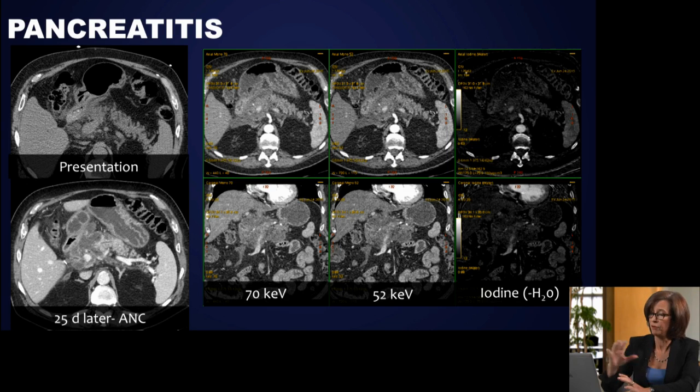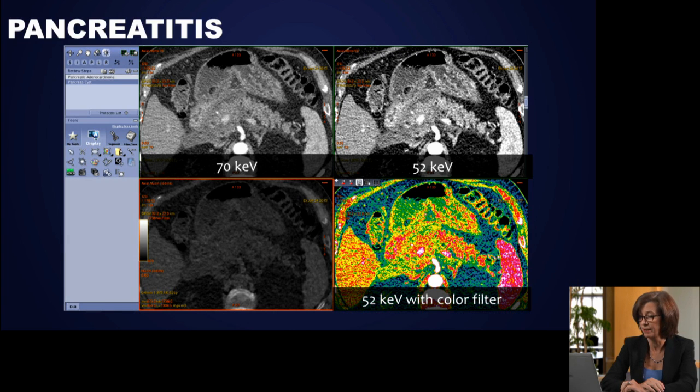So here, I've just popped it into the GSI server in our standard pancreas adenocarcinoma mode. You can look at this to look for iodine to see if there's residual iodine in that area that looks dark on the CT. Or you can try the cystic mode here to look for whether or not it's just purely fluid, which it's clearly not in this case in the lower right. And you may not want to look at mucin. We don't think that there's mucin in here. We think that we're looking for enhancement.